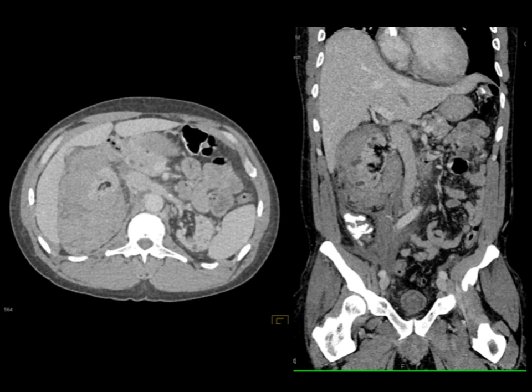In theory, what causes bleeds? Well, it could be a renal cell carcinoma, but I don't see a mass here. Now, sometimes masses can be hidden, but the key thing is the end-stage renal disease with the multiple cysts. And so we do see a perirenal hematoma. I guess in theory, patients with end-stage renal disease have increased incidence of small carcinomas. You could miss one. So I'd give you half a point credit, perhaps.